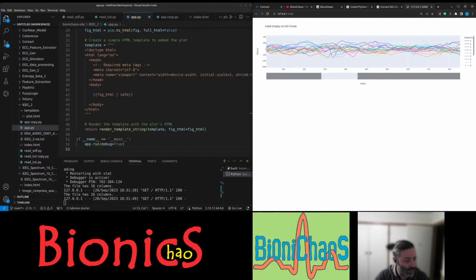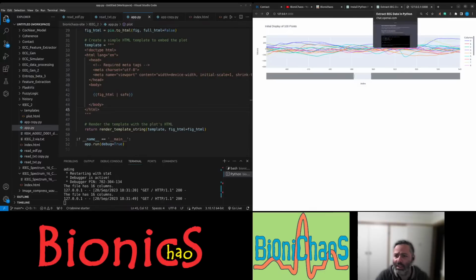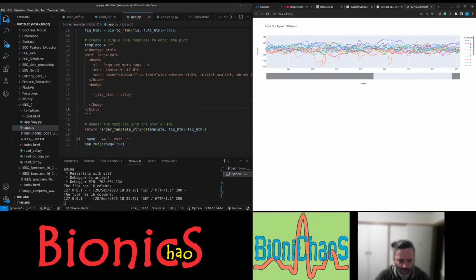This one is looking much better, isn't it? I can compare the two. Well, once it's loaded, we can do a quick comparison. We actually should do a quick comparison because theirs should be more accurate because that's the original implementation. But this one is definitely way faster. If it's not doing the speed on the website, don't use it.